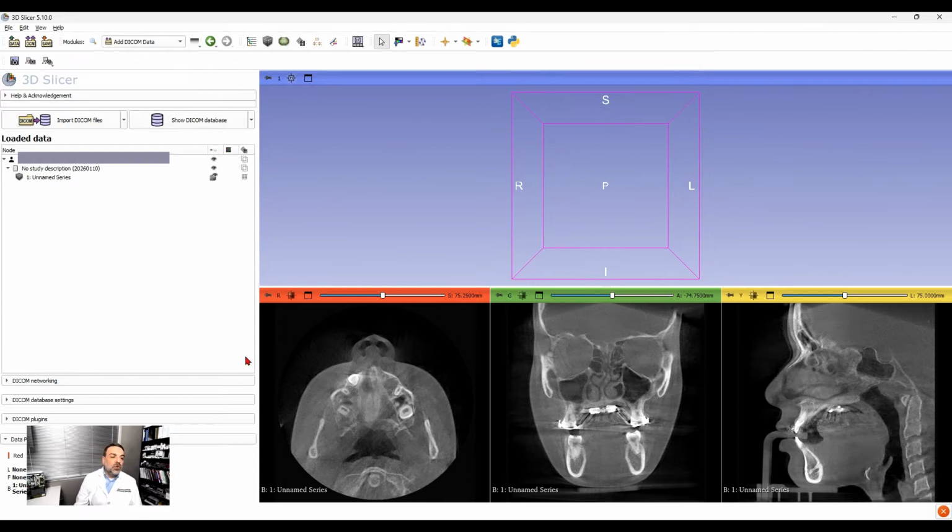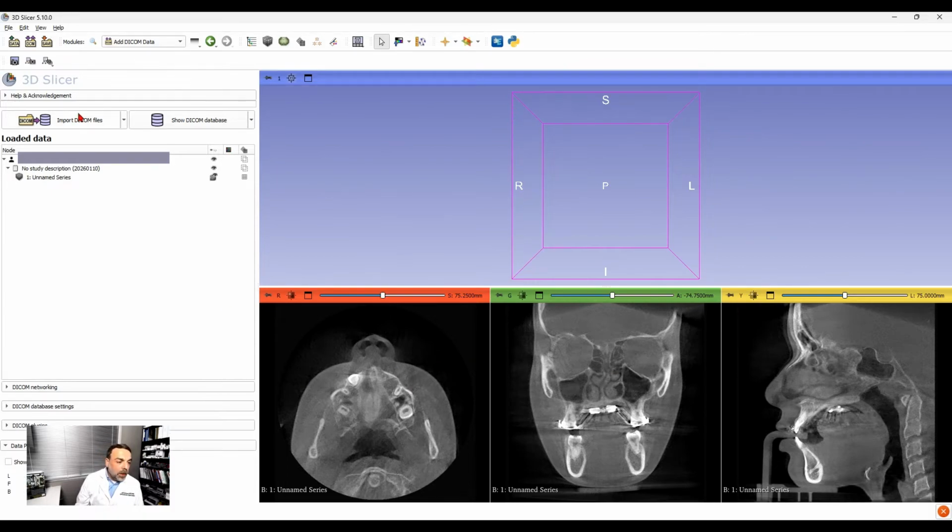So what I want to first change, see here, it says the patient name, I'm going to mask this one, but change this one from unnamed series and put a name for it, rename, we'll name it CBCT before rendering. Okay, so now we have the name here.